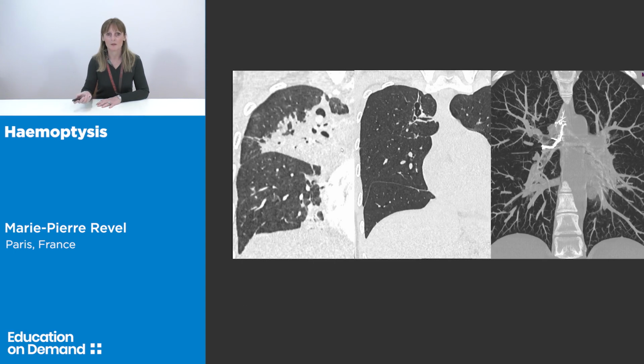And so this is the initial CT, the CT performed 1 year after, and as you can see, there was a very good evolution in this case.